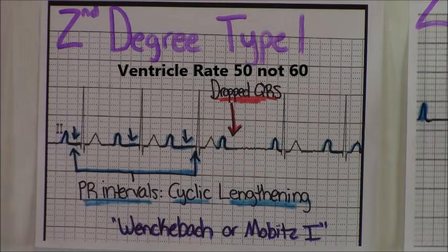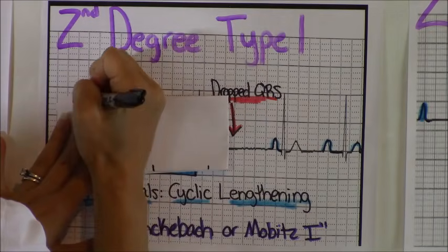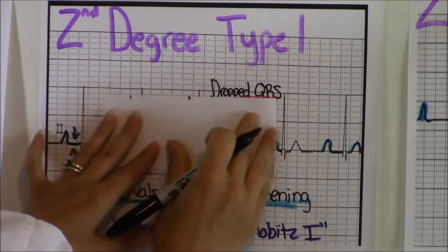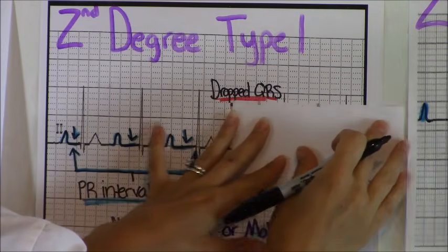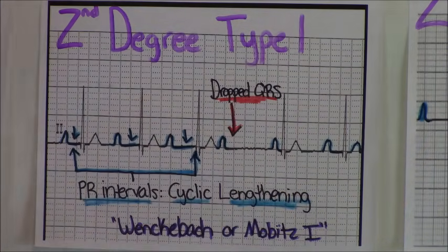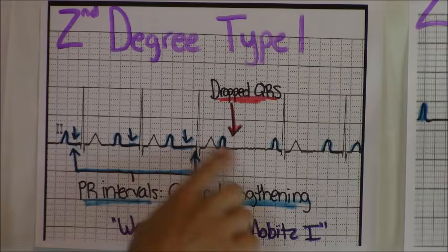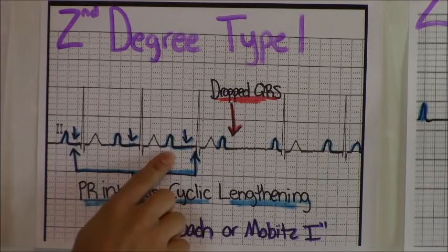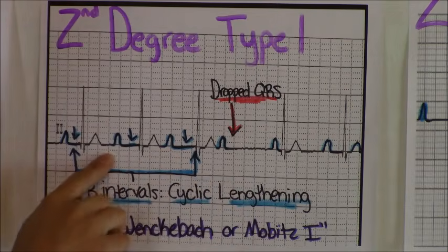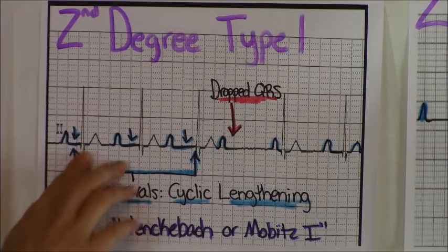And are the R waves regular? So let's measure those out. And our R waves are most definitely not regular. So no. We're going to look at our PR interval, and you can tell just by looking at this that your PR intervals, remember you measure right here to the beginning of the QRS, are definitely lengthened. You can measure that out. It looks like it's greater than 0.20. And our QRS looks good.